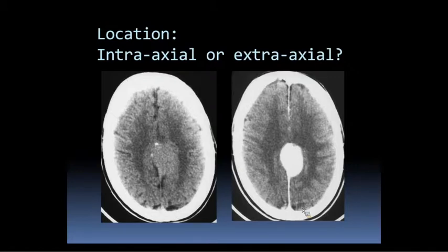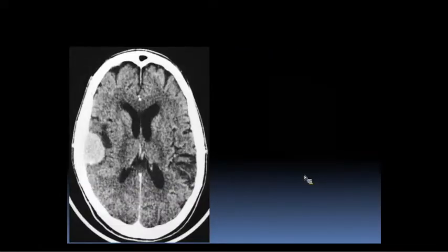So this is an extra-axial lesion, and here you can better see the gray-white matter differentiation. All of this denser stuff is gray matter cortex, and the darker stuff centrally is white matter. So this is the gray-white matter junction, and it's pushed away from the mass. That's what tells us that this is an extra-axial mass. And the most common extra-axial mass is meningioma by far. So here, do you think this is extra-axial or intra-axial?